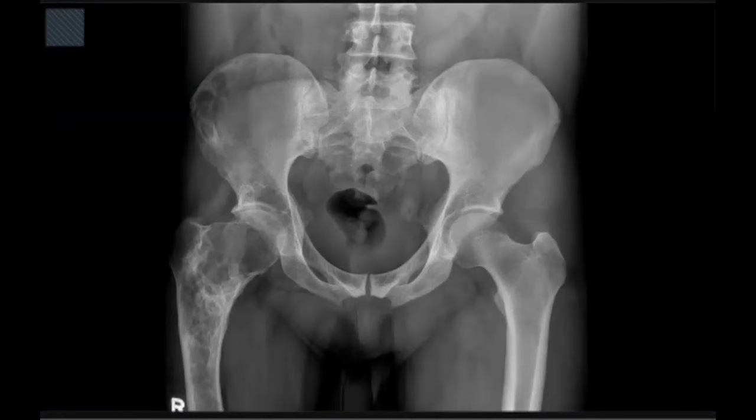Okay, so I'm presented with this patient. I will give you the history. In the exam, wait for the examiner to give you the history. Okay, 40 years old male patient with hip pain, no trauma. 48? 40. 40, okay, 40 with hip pain with no trauma.